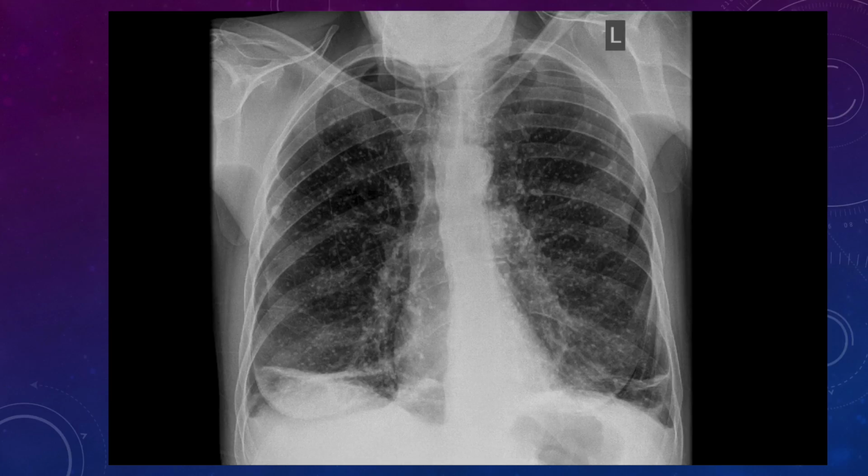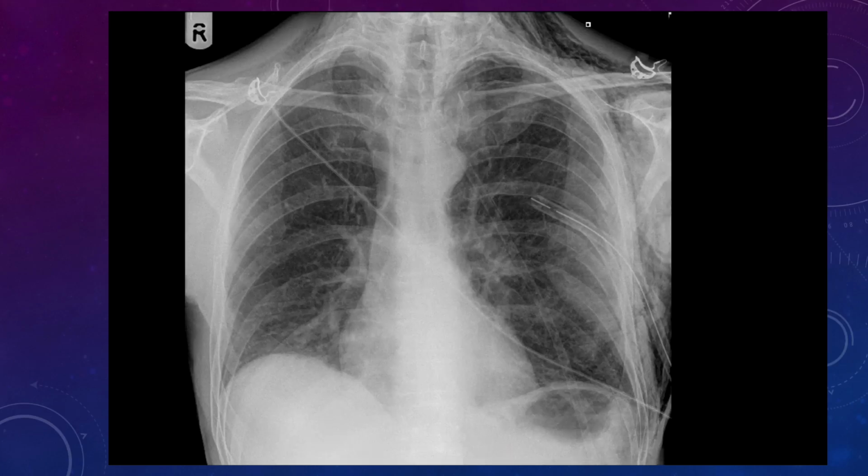Okay, so it's just taking into account things that are going on within the lung fields. Don't dismiss the lung fields. If they look wrong to you, there probably is something wrong, because you've seen enough chest x-rays over the years to know what a normal lung field looks like. So if the lungs look wrong, they probably are wrong. So you need to be doing something about it, alerting somebody.